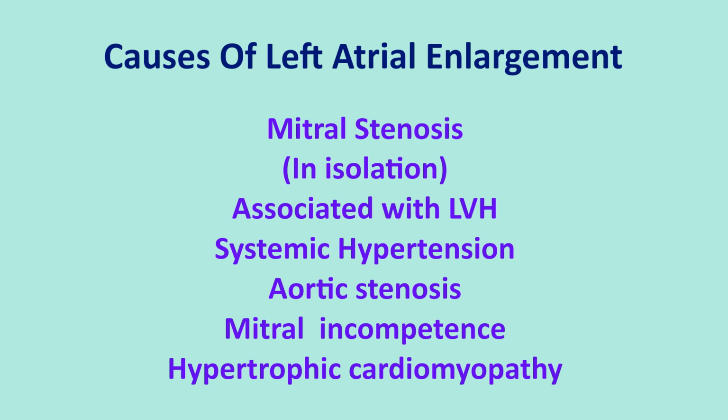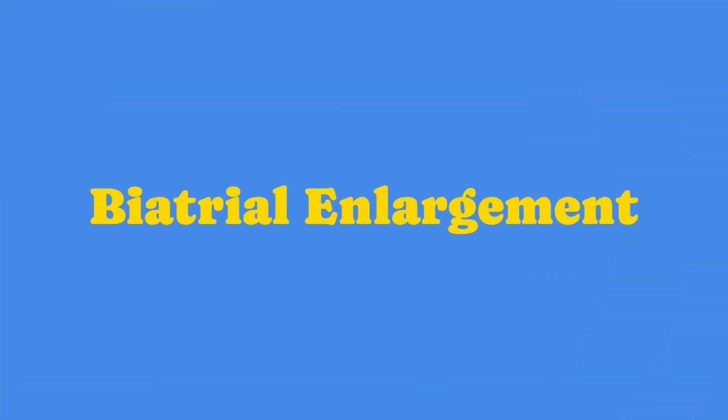Causes of left atrial enlargement. Isolated left atrial enlargement is seen in mitral stenosis. Left atrial hypertrophy along with left ventricular hypertrophy includes causes such as systemic hypertension, aortic stenosis, mitral incompetence, and hypertrophic cardiomyopathy. Biatrial enlargement.